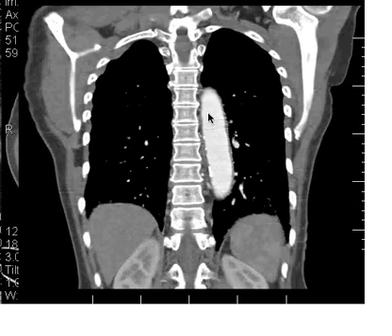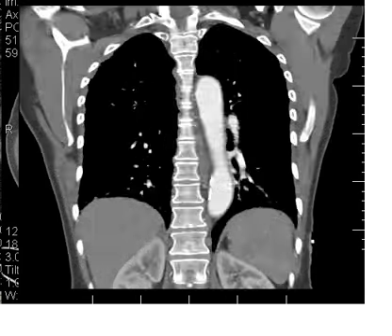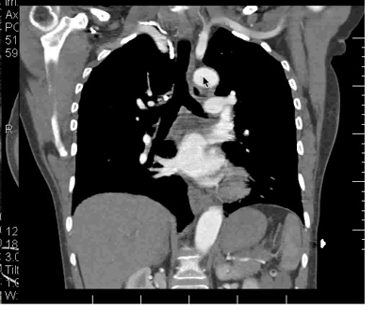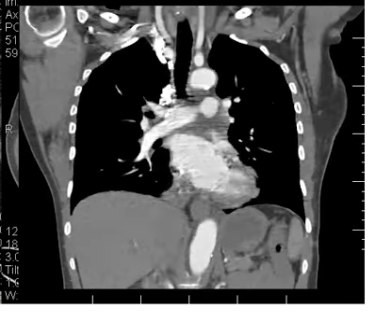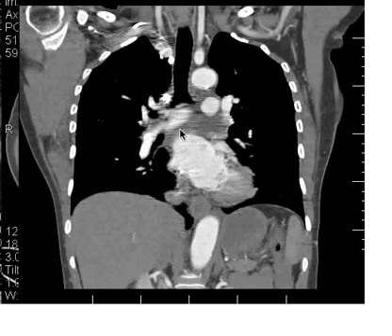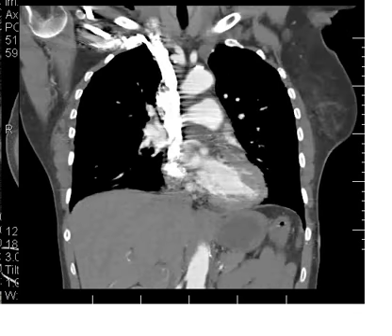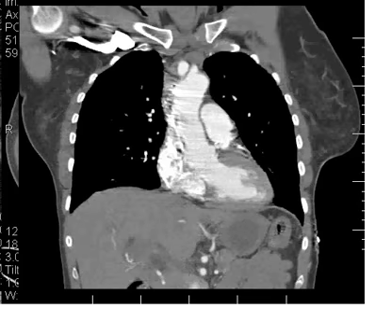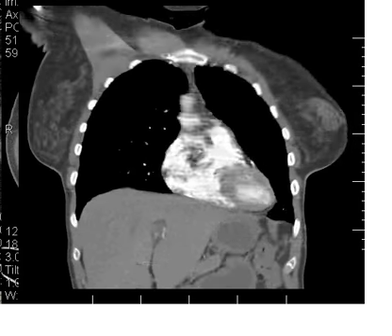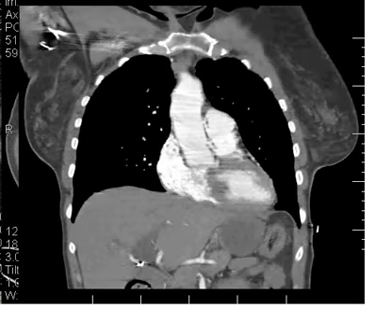Here we have the descending aorta, of course. So we move forward and follow the aorta, and here you see we are coming into the aortic arch. So you know that the main vessel beneath that, inferior to that, is going to be the pulmonary artery. And so here we have two pulmonary arteries, a right and left pulmonary artery. And then if we continue forward, remembering that the main pulmonary artery arises from the right ventricle and dives up and back, superiorly and posteriorly, here we have a coronal image showing beautifully.